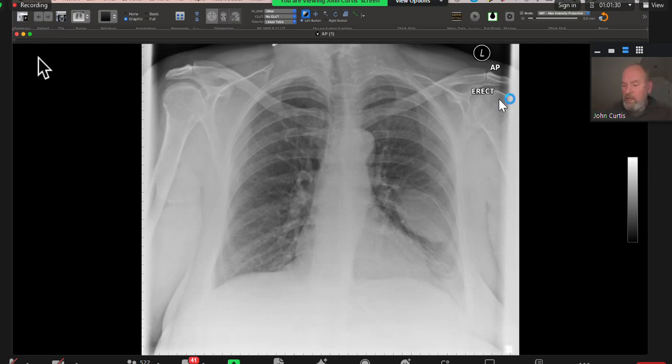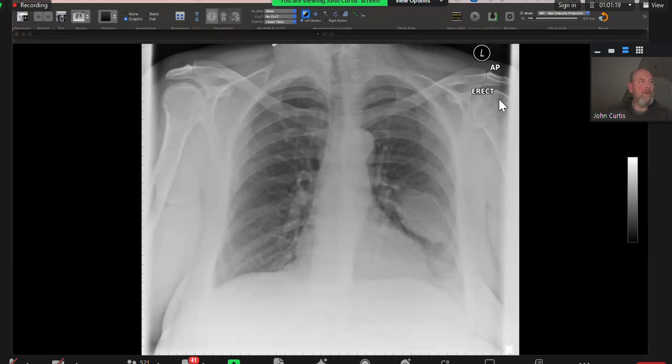What do you think the most likely diagnosis is? I was suspecting that it's going to be lung with bone metastasis. Okay. Other differentials to consider, I can't see any breast shadows to suggest that this is a female patient. What does the scalloping of the rib suggest? Scalloping of the ribs could suggest other differentials, and osteosarcoma could be one of the differentials to consider.